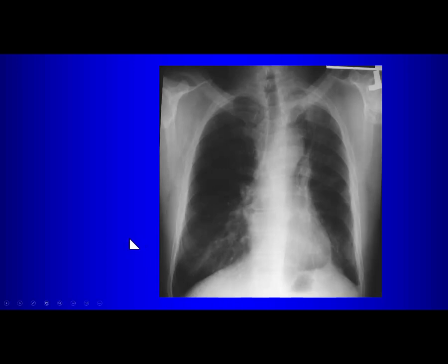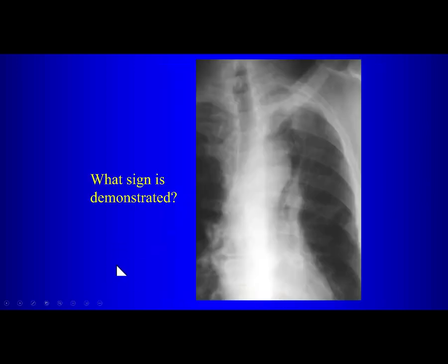Because it's easy to say, oh, he's going to show me a case of left upper lobe collapse next because that's the order we're going in. But when you're sitting in the reading room interpreting an x-ray that looks really funny, you have to sit there and ask yourself these questions. What do you see? What is abnormal? And how does that fit into my interpretation of what the overall pathology is on the chest radiograph, okay?